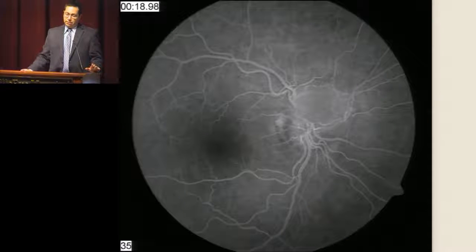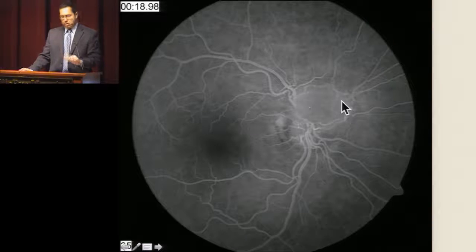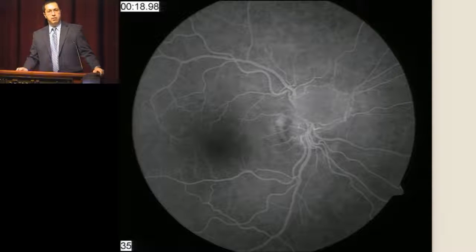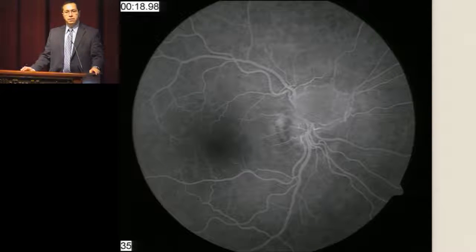Fluorescein angiography, you see this is the venous phase. And on fluorescein, it's overall not very bright, but you can see some vessels inside it. This is the typical appearance of astrocytic lesions. Early, they are not very bright, but you see some vessels there. And this is actually very helpful in differentiating them from retinal capillary hemangiomas, which have a very rapid transit phase. They become bright very early. So this is a very helpful differentiating feature.